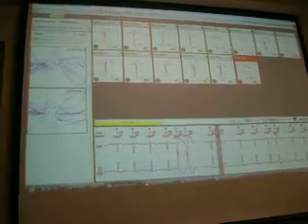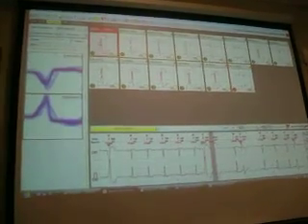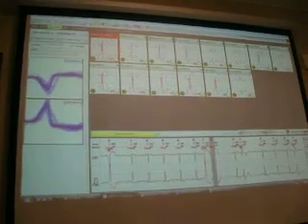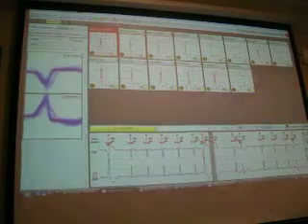I will show something interesting with these clusters, but before I do it, I set the correct type of the clusters. This is good.